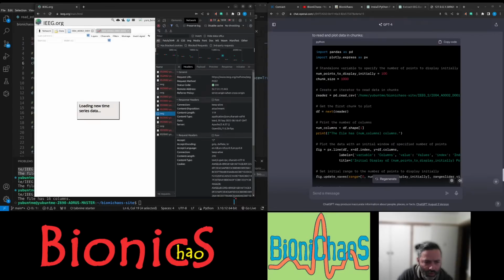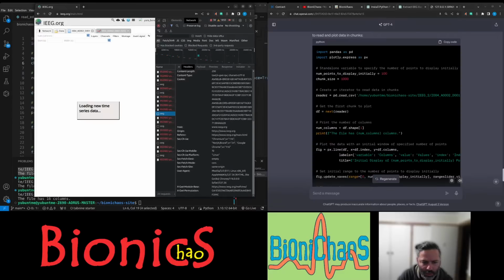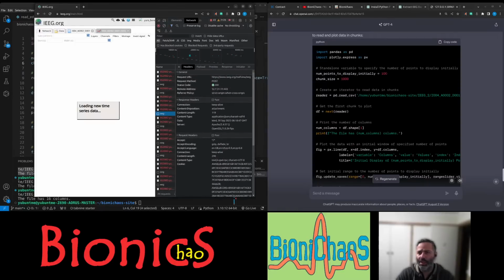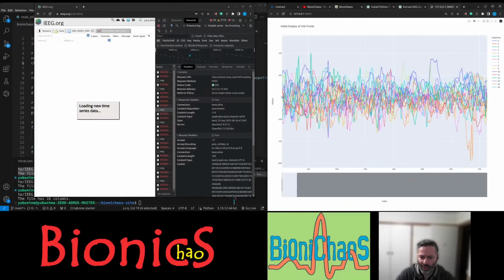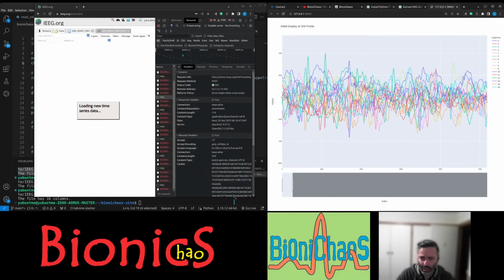It's having trouble, getting a lot of errors. There's a cookie. Why is there a cookie? It's monitoring my browser type. Yeah, that's okay. What we're trying to do is confirm that this data is loading correctly.